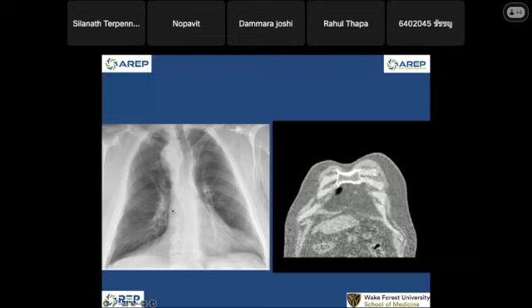Start from the heart. Does the heart look okay to you, or is it a big heart? It's very big. We are seeing a shadow coming down here, right? Okay, big heart. What else? Is it the pulmonary vasculature? Does it look like the pulmonary edema from yesterday? Does it look busy to you? The pulmonary vasculature will be very, very prominent in pulmonary edema.